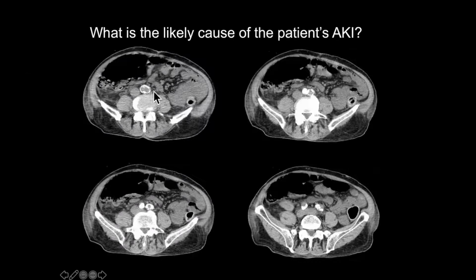So here you see the distal aorta, and you see a lot of atherosclerosis and a big old chunk right there at the ostium of the right iliac artery. And this is, of course, the iliac is where they plug into and attach the vasculature of the transplanted kidney. So this is a case of obstruction to the kidney due to atherosclerosis of the native arteries.